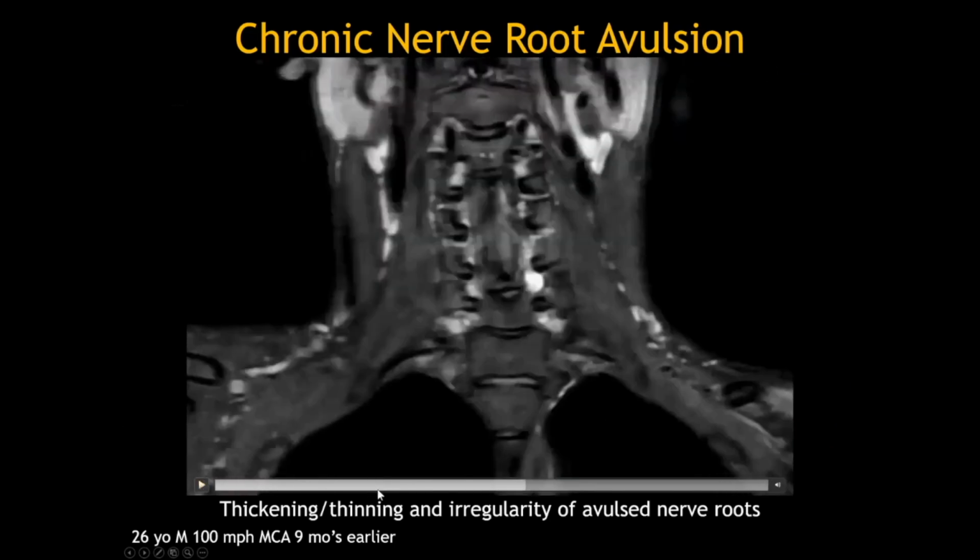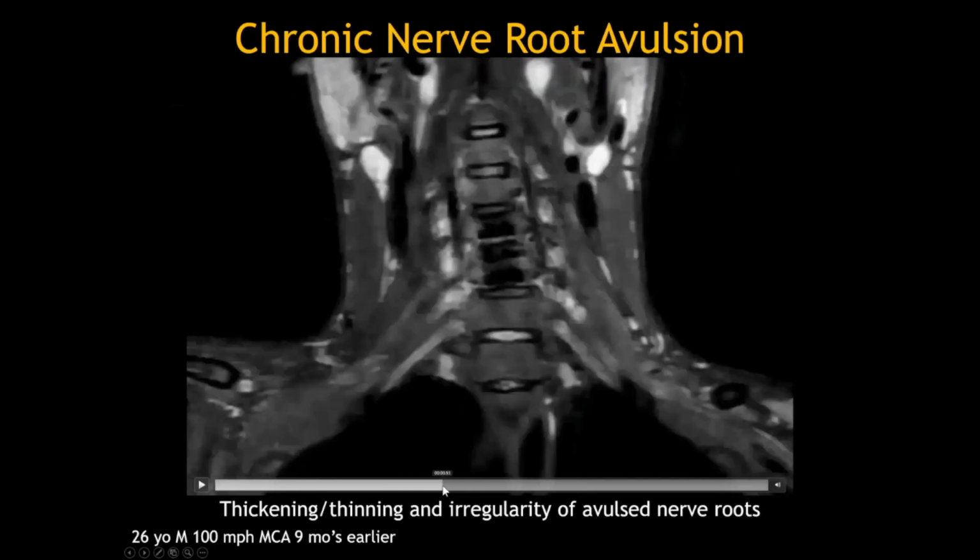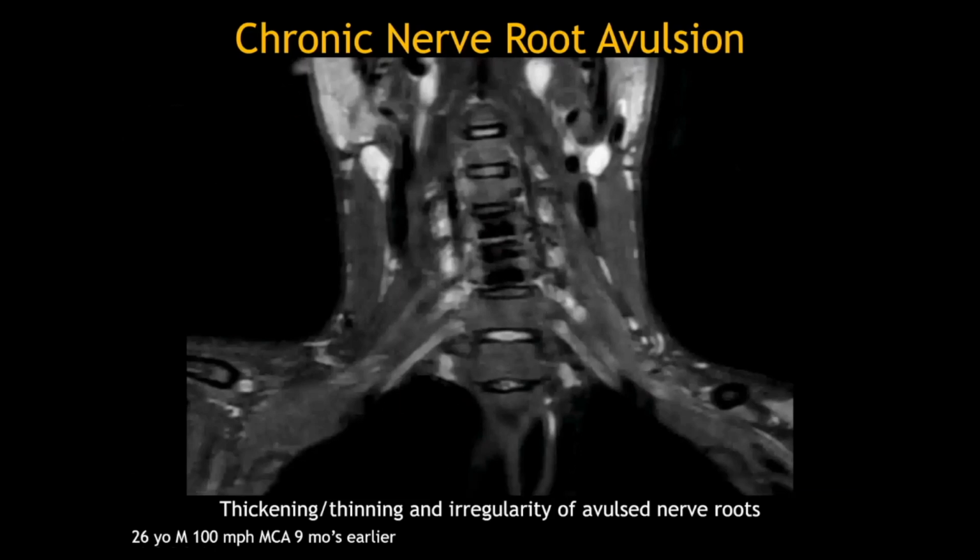And here's the same patient, their brachial plexus MRI. Again, we can observe the presence of pseudomeningoceles related to the preganglionic injury. And we can actually see the difference in side-to-side appearance of the affected brachial plexus, where we can see these areas of nodular thickening related to retraction of those avulsed nerve rootlets from the neck. And really, I think in combination with the CT myelogram, this helps to cinch the diagnosis.